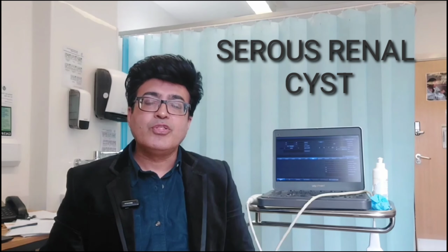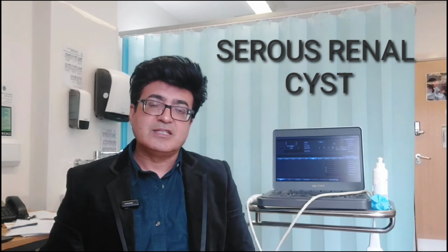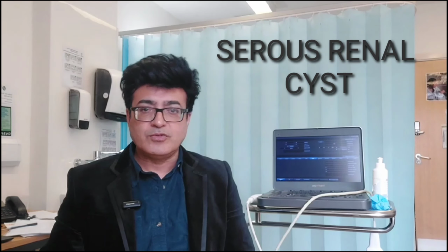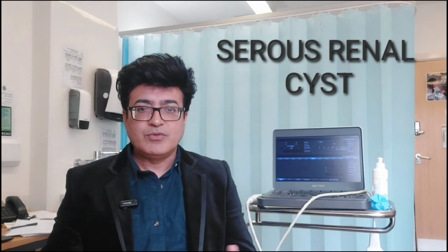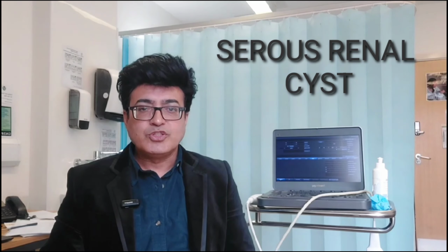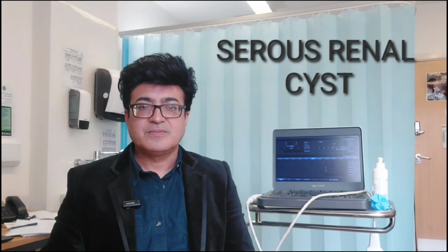How will it appear on CT images as well? On CT images, the CT density would be 0 to 20 Hounsfield. So let's start watching images for the simple renal serous cysts.